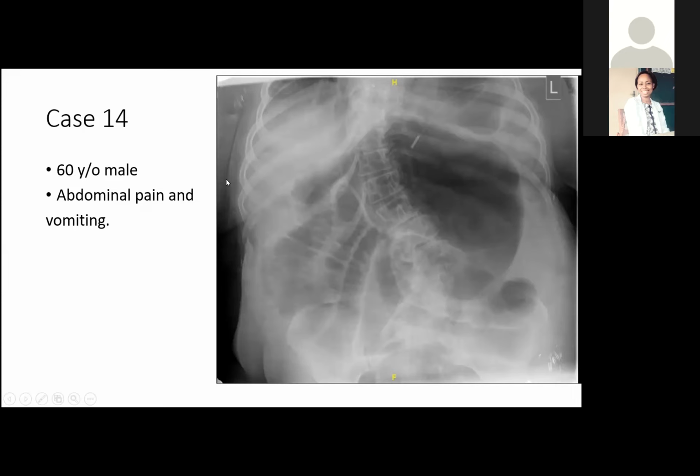Obviously there is a distended structure. I'm not sure if that's stomach or if that's bowel right up there. It does appear there is... I'm not sure if this is a pacemaker lead or an NG. But it's a nasogastric tube. Yep. Carry on. Oh, thank you.